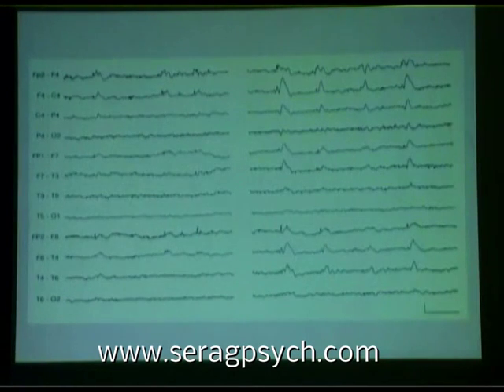Next, please. The other thing I showed you the other day, yesterday, was these little things here that look like little muscle potentials from small eye movements. And that's true. Most of the time, these are. But be very careful, because notice what happens here. These look just like what I showed you as being from artifact around the periocular muscles, you know.